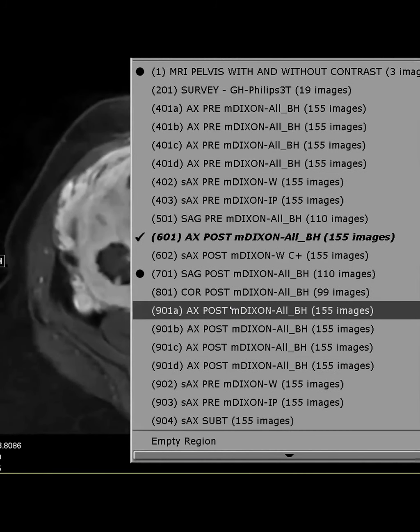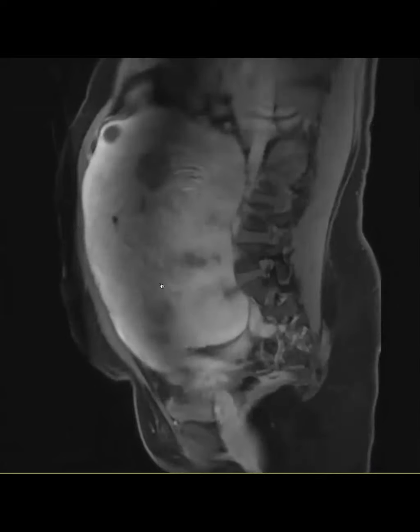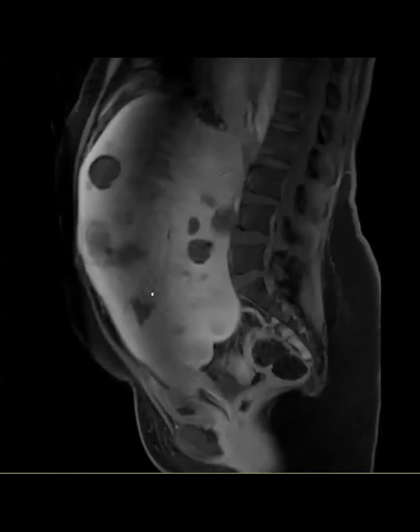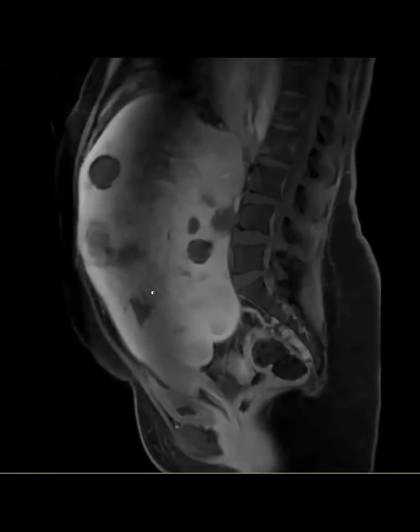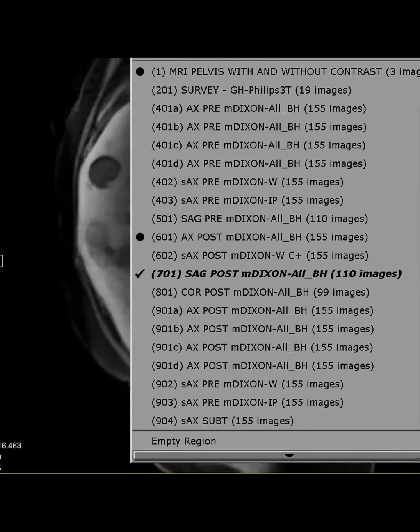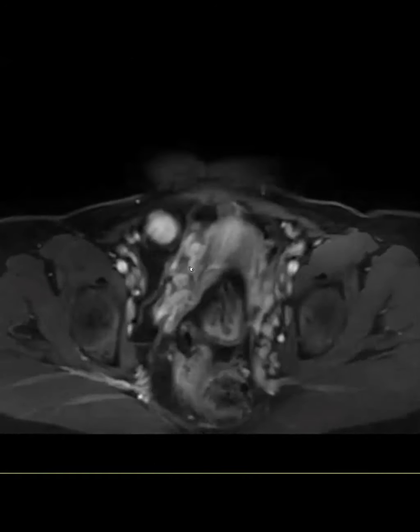And we generally see these polyps with cystic spaces in patients who are treated with tamoxifen, but I guess it doesn't have to be just tamoxifen specific. It's hard to see on sagittal, so just see this enhancing color. Probably the axial has the best look to it. So this is just a huge endometrial polyp with cystic spaces.